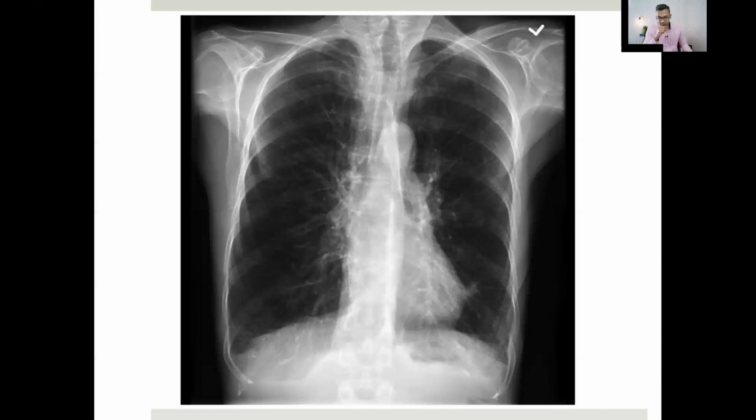So I guess you could look for infective causes, and then also bullous changes if she's had a pneumothorax or something. Great. So what are the infective causes? Absolutely something you look for. Looking for pneumothorax, because she might have bullous changes and something would have burst. So that's not there. How about another complication of it, pulmonary hypertension? What would you see then, maybe?